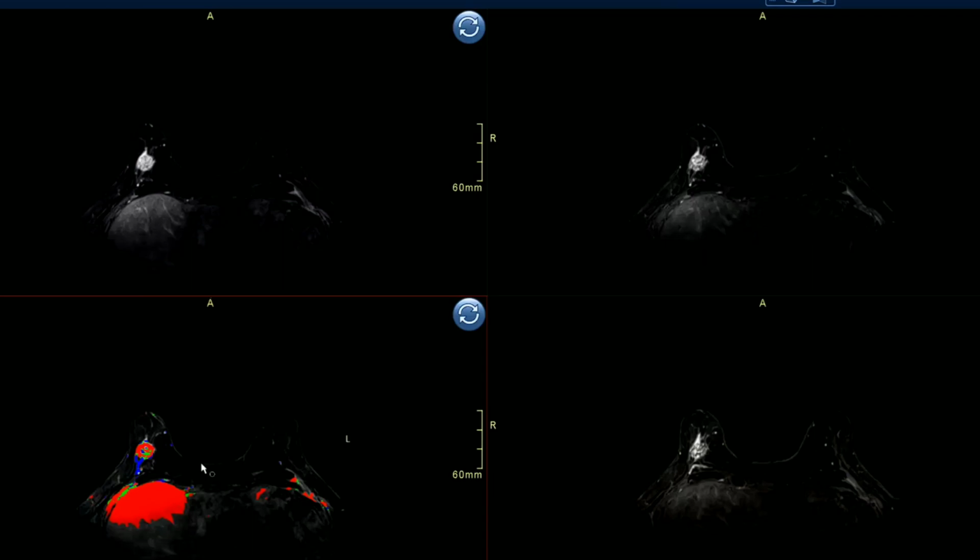Okay, ma'am. The next question is how to differentiate between BI-RADS 4C and 5. Okay, so it's not a very big difference. When something is looking highly suspicious to you, then you need to put it into 5. When there are lymph nodes, the first case we saw, there's that mass, ugly mass. It had pleomorphic microcalcifications. You can see enlarged lymph nodes. You can see they have microcalcifications. That is 5. If there's a single thing which is spiculated, or even if it's well defined. I might have another case here.